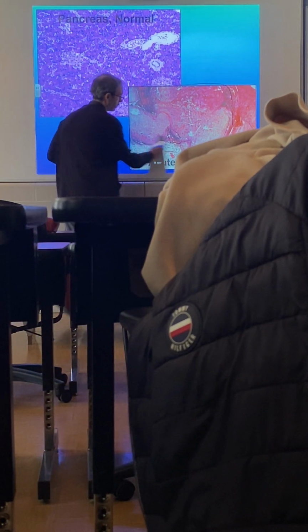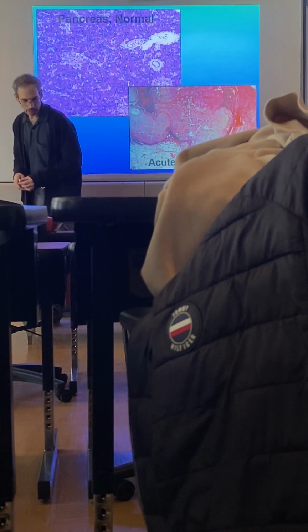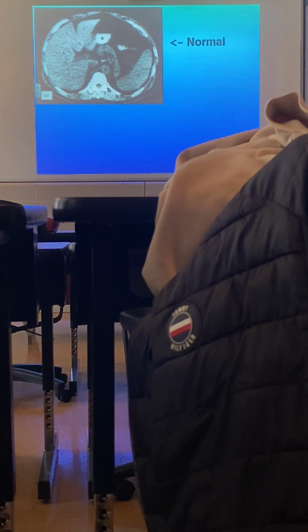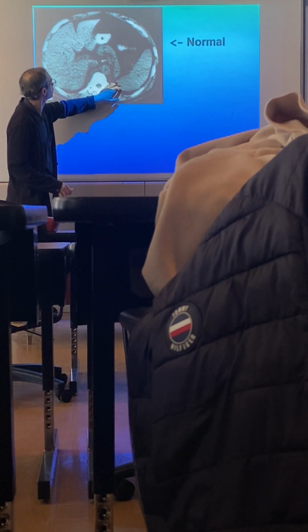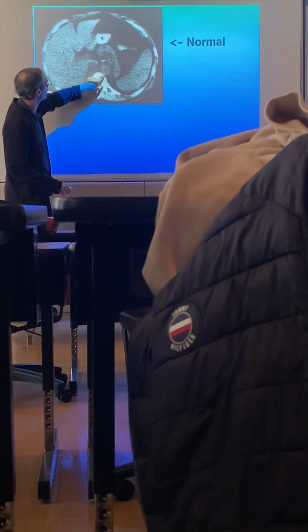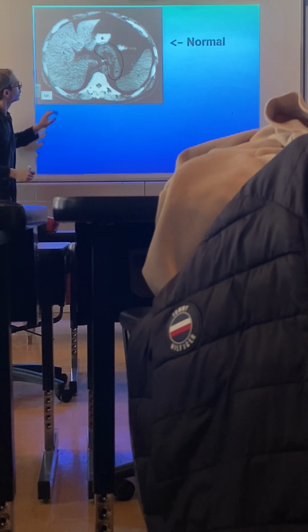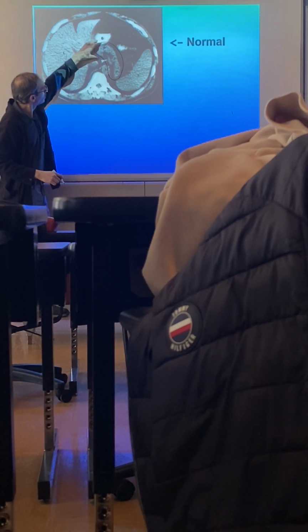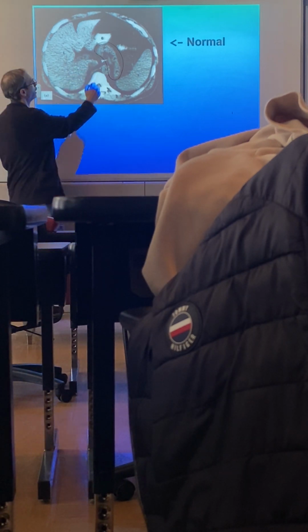Let's have a look at the radiographic appearance of acute pancreatitis. This will allow you to appreciate just how inflamed the pancreas is. Here is a normal pancreas, so CT scan, anterior, posterior, right and left, normal liver, normal spleen. There's some oral contrast in the stomach, descending aorta here. And of course you can see, there's the pancreas. This is the head, and there's the tail. Take a look at the size of the pancreas compared to the vertebral column for scale. Okay, everything looks good there.